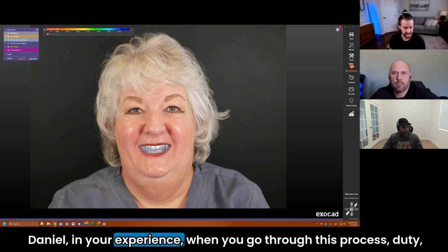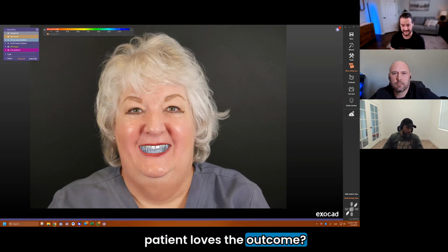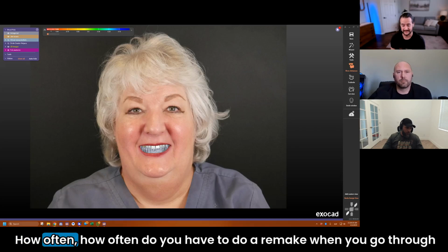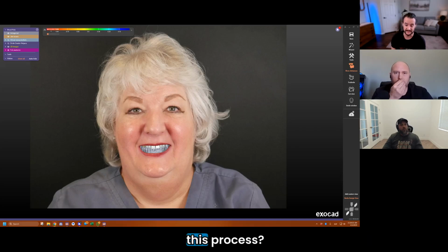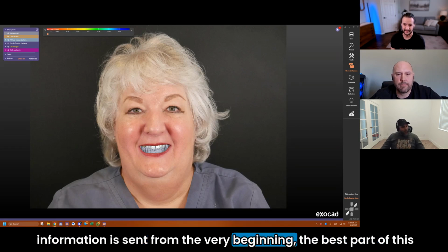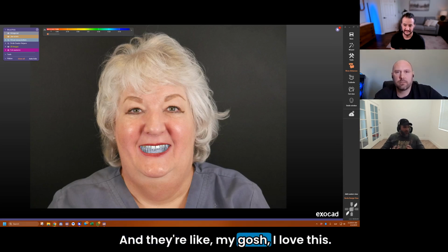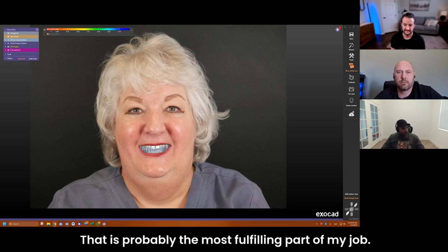Daniel, in your experience, when you go through this process, 2D smile design, 3D mock-up, what is the percentage of time that the patient loves the outcome? How often do you have to do a remake when you go through this process? Well, going back to the beginning, as long as good information is sent from the very beginning, the best part of this is hearing that the patient cries. And they're like, oh my gosh, I love this. That is probably the most fulfilling part of my job.